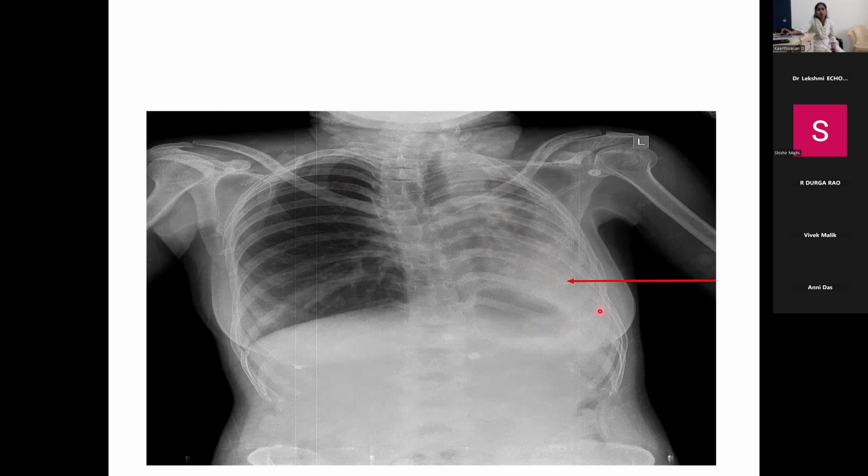So you cannot say this is an effusion because you have all other findings of fibrosis here, although the CP angle is blunt. Okay, but you cannot say this is effusion. Look for other additional findings. When you are having gross pull towards the left, when the gastric bubble and hemidiaphragm of the left are shifted upwards, this cannot be an effusion. This is a collapse.